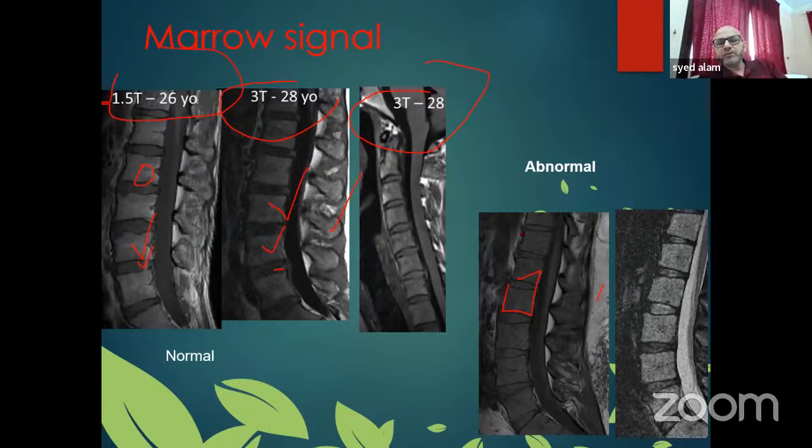So this is a case of diffuse multiple myeloma. If you have knowledge about this, you can catch multiple myeloma, which is a serious condition. Whenever I find the marrow is dark on T1, I just say dark marrow on T1, please correlate with the lab findings. It's very simple. They can do some lab tests and they will know whether the patient has anemia or other causes. There are some physiological causes and pathological causes.